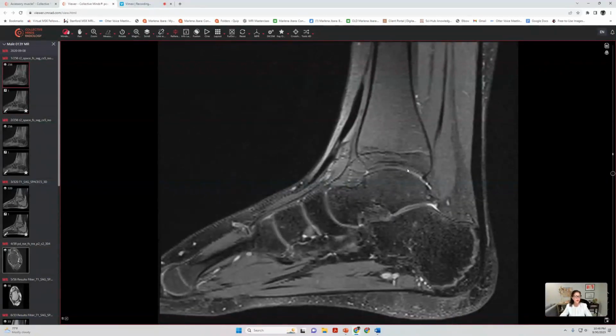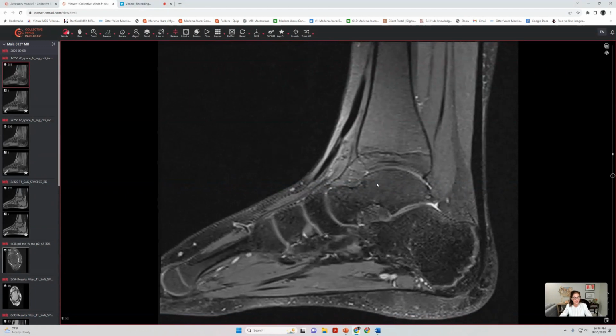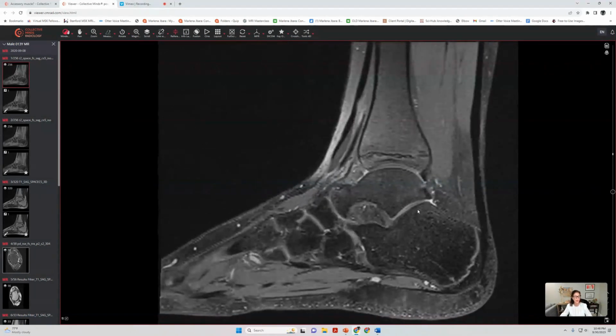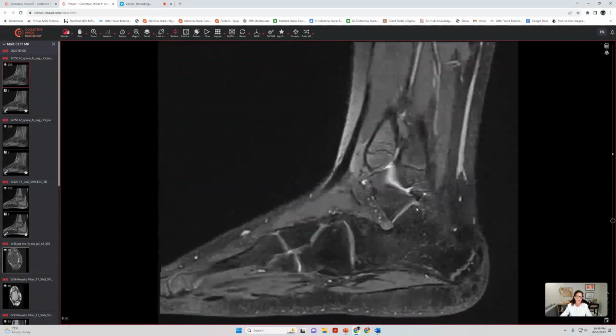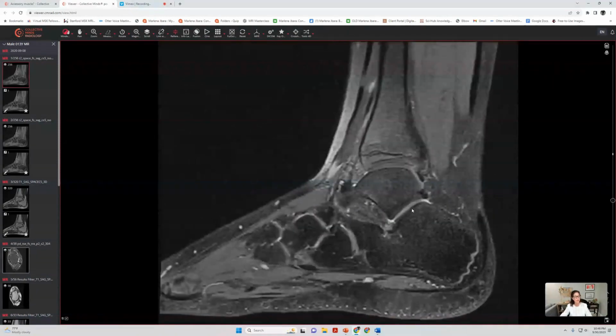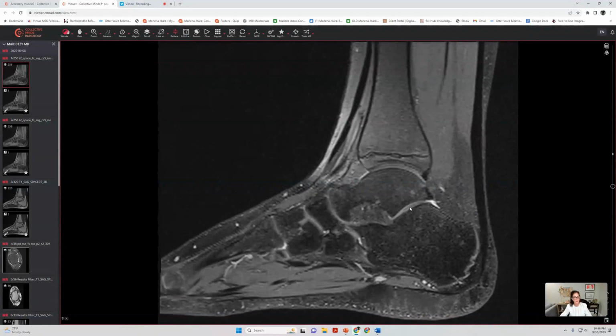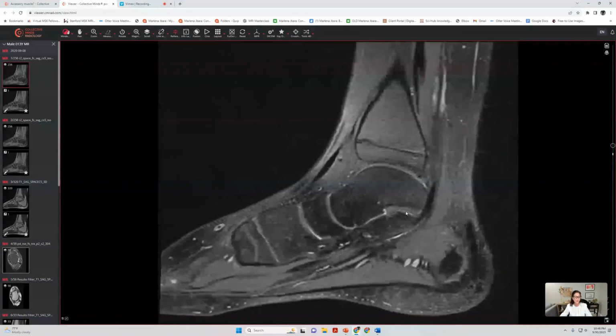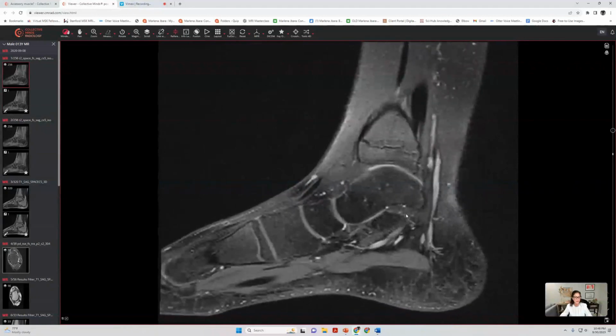And this is where we're going to see some of our osteochondral injuries if they're present at the talar dome, at the tibio-talar joint. We can also appreciate whether or not there's the presence of coalitions, looking at the layers of cartilage. We can see 2 layers at the posterior subtalar joint here. We'll be moving towards the extra-articular anteromedial facet seen here.